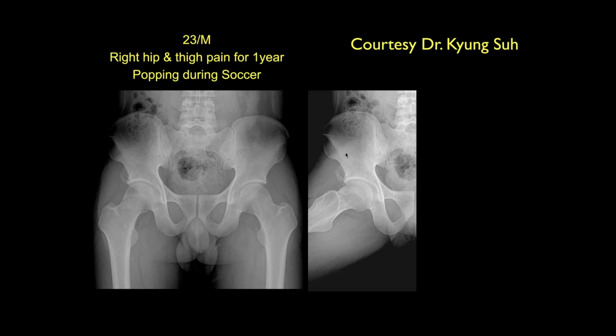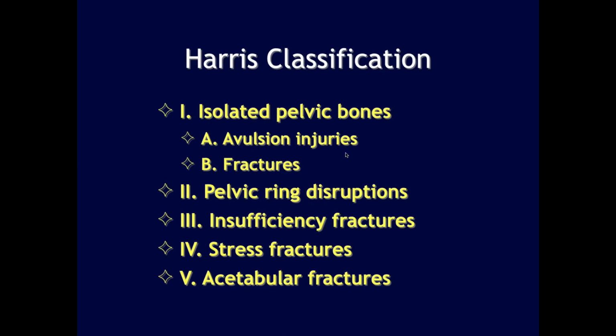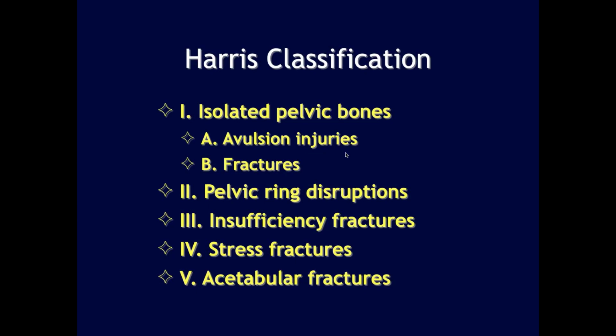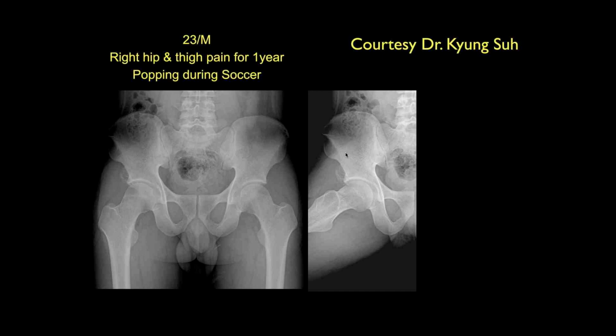So never use it, John. Yeah. Poor hair finally got some kind of a notice here. So Salter Harris. Mm-hmm. Canadian. Yeah. Michael, what do you think here?